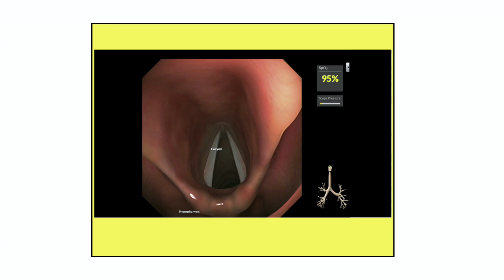Next we'll have a video demonstration of a virtual bronchoscopy. This is the software that we are going to run through during our workshop. You'll have plenty of time to go through some different scenarios and also to appreciate the normal anatomy. First we'll have a look into the normal anatomy before you go to the workshop.